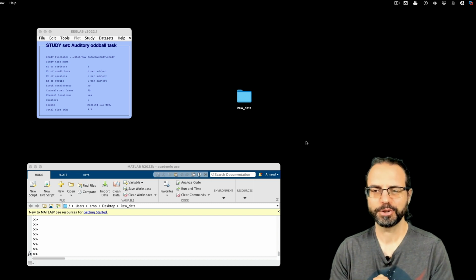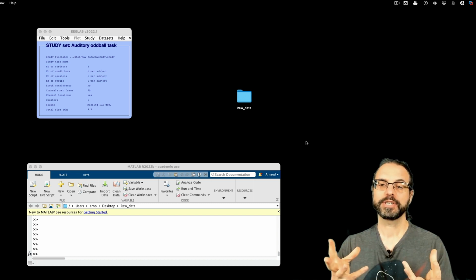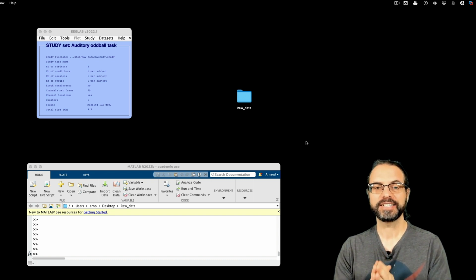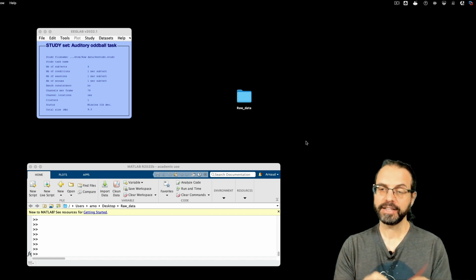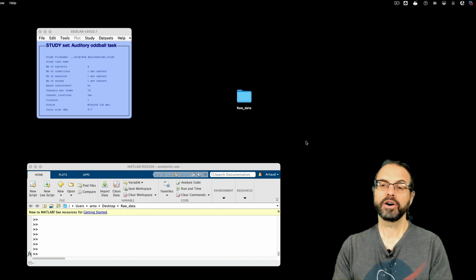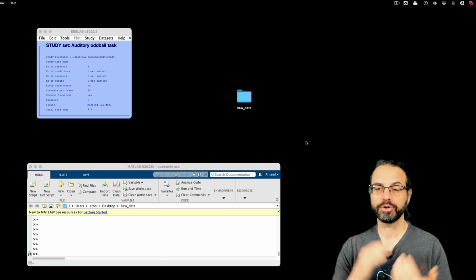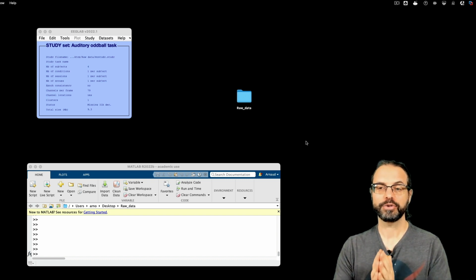Hello, my name is Arnaud Delorme, and this video is about showing you how to export BIDS data from raw data to BIDS exported data, hopefully showing you that it is very simple to do so and how you can upload your data onto a repository.